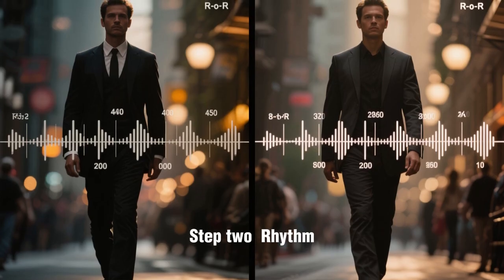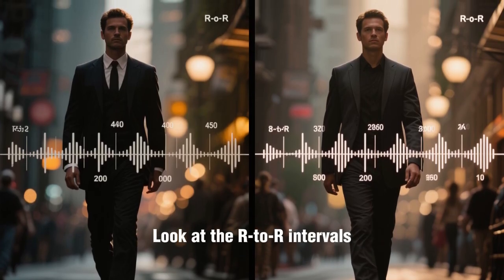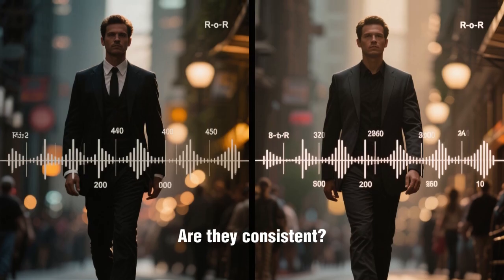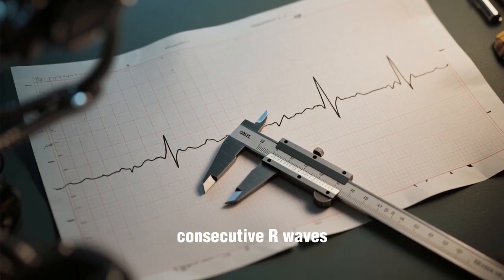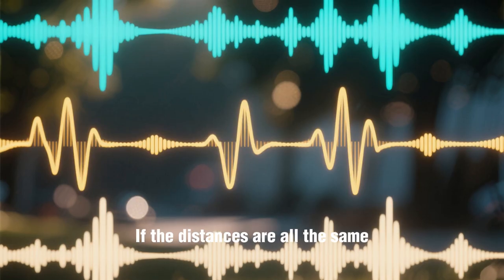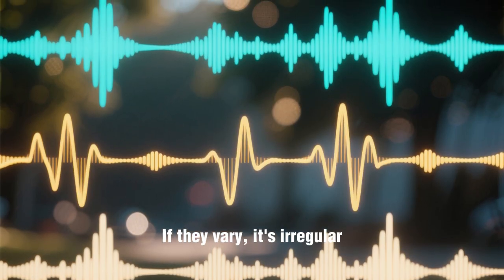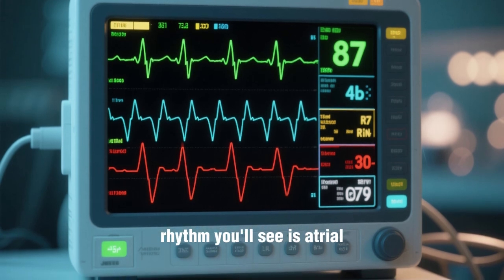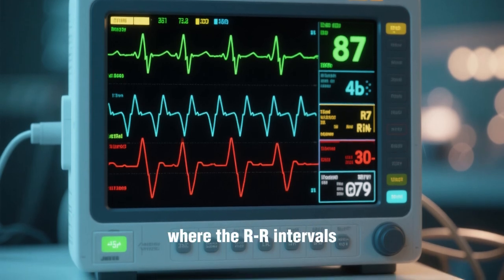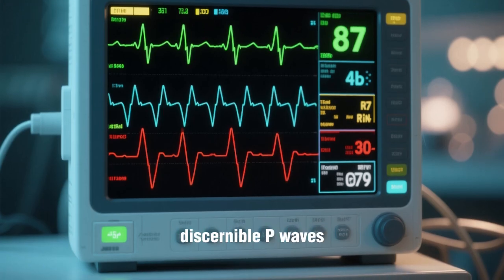Step 2. Rhythm. Is the rhythm regular or irregular? Look at the R-to-R intervals. Are they consistent? Use a piece of paper or calipers to measure the distance between a few consecutive R waves. If the distances are all the same, the rhythm is regular. If they vary, it's irregular. The most common irregular rhythm you'll see is atrial fibrillation, where the R-R intervals are all over the place and there are no discernible P waves.